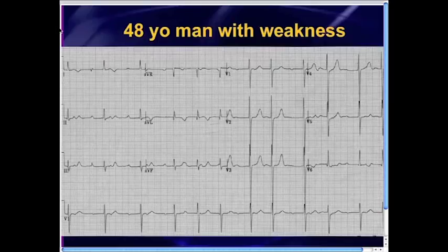we're relatively happy about this ventricular rate, but there's something going on in here that's a little bit hard to define. The R to R interval is changing. It looks like it's getting shorter, and then there's another one right there, and then it goes back to long and then short. Anyway, the R to R interval is messed up, to use once again a technical term.